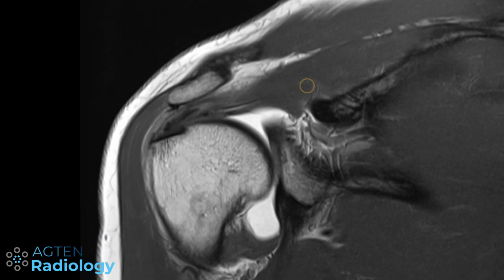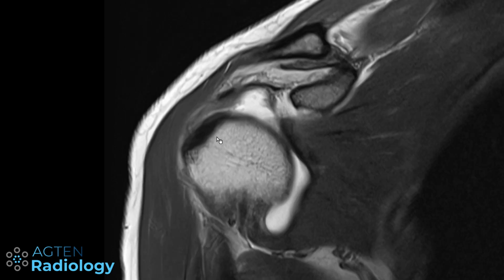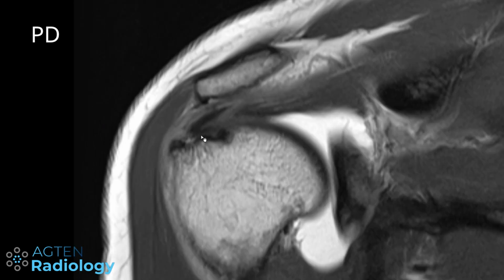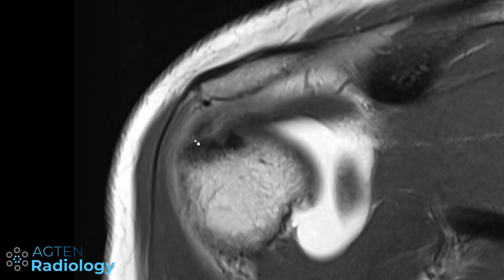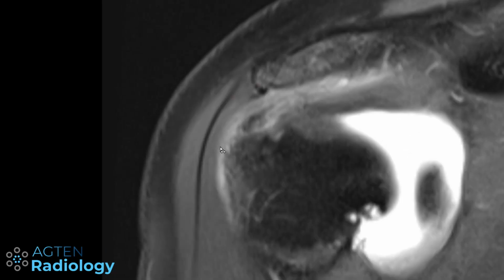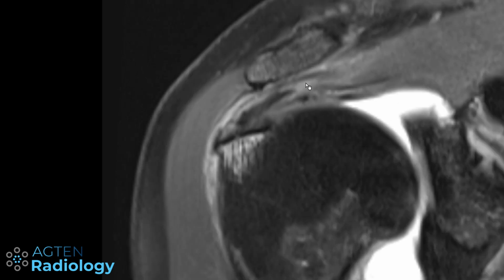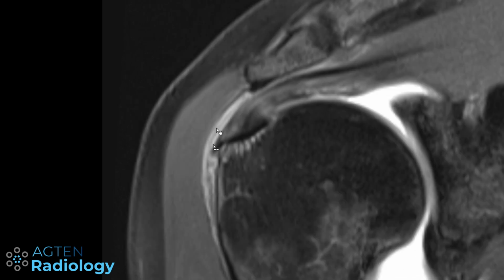Now here a roughly 60-year-old patient, and this is again anteriorly subscapularis, long head of the biceps tendon, and here we have the supraspinatus tendon. And if we scroll posteriorly, we can see the signal in the tendon is quite busy. We have these hypointense aspects, and then we have some hyperintense stuff around it. And we also need to have a look at our fat saturated images in this case. So here very bright signal, then here bright signal, then here the darker aspects, a little bit of bone marrow edema, and a tiny probable tear at this site with adjacent bursitis.